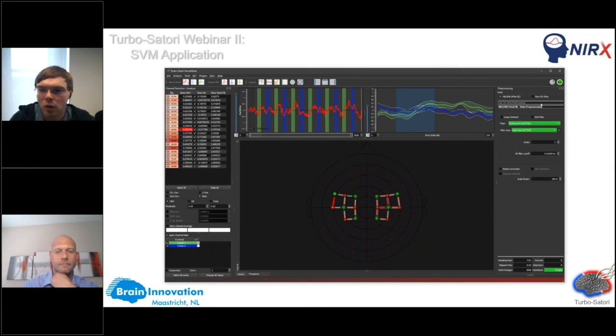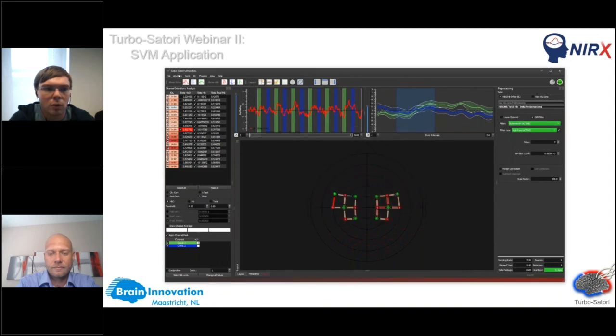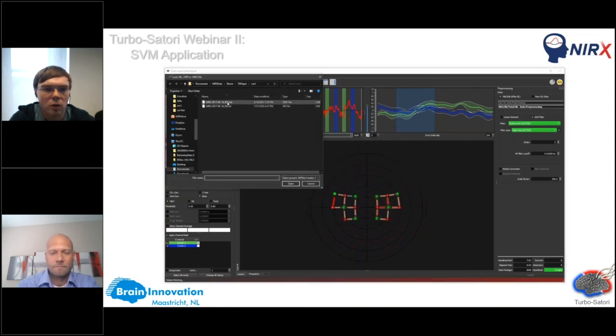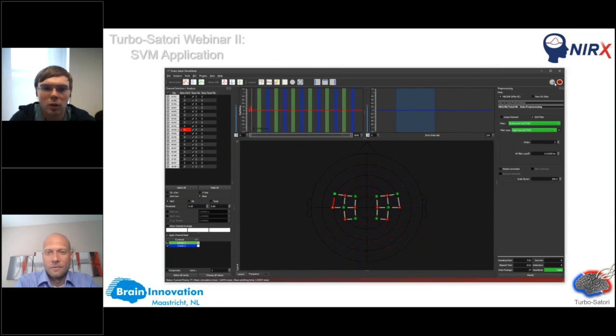So we just click here at channel confound predictors and press OK. And now in addition, you can say use GLM filter. And this will basically result in a GLM, which is calculated based on the confound predictors used here, and will clean the data using these confound predictors. So I can show you how this looks like. You just run the data again. I'm sorry for the delay with the loading. So now you will basically see the signal cleaned with the two channels on the side.